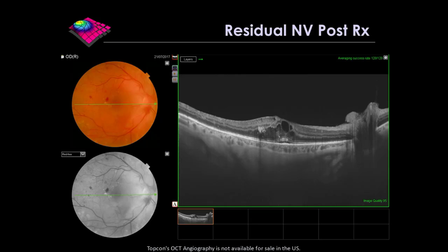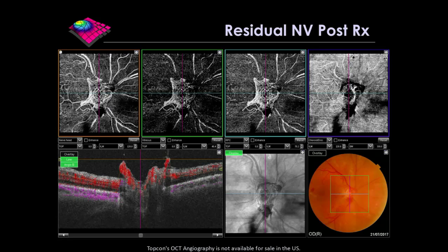Now, here is the main thing that we're interested in. And we do the angiodisc. And what you can see very nicely is that there's the neovascularization at the disc. Now, a key point that I want to highlight, though, is that in a lot of these patients, rubeosis, proliferative diabetic retinopathy, cataracts, they often have motion artifacts with them, or you might struggle to get very high quality scans in some cases, and sometimes the en face images don't show this as beautifully as you would like.